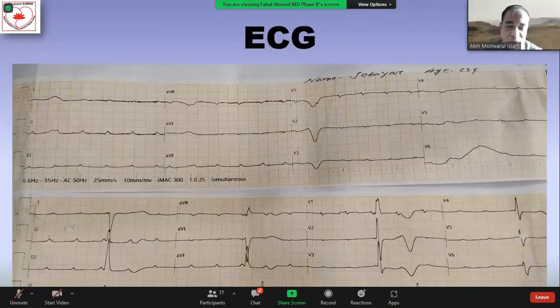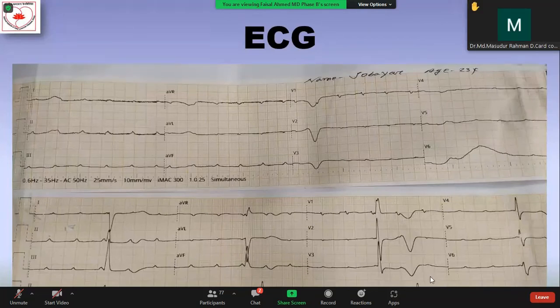Is it a case of complete heart block actually? It is a $1 million question. Faisal, sir, can you answer?